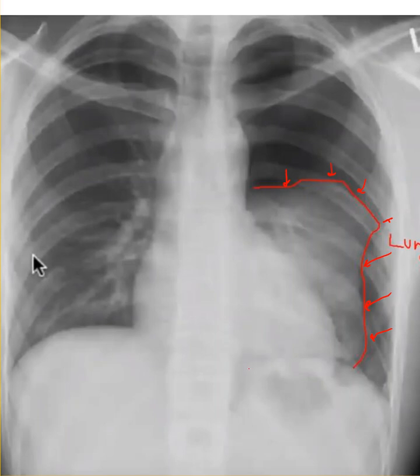But of note, look at this diaphragm. So the right one is fine, and the left one looks normal now. So that diaphragm on expiration has come back up, and it looks like a normal diaphragm, which is interesting. Now you might see this little dark area here. That might represent some air in what's called a deep sulcus sign. Although normally you get that when the patient is supine and not upright, it's a big pneumo, so I wouldn't be surprised if there's some air over there.